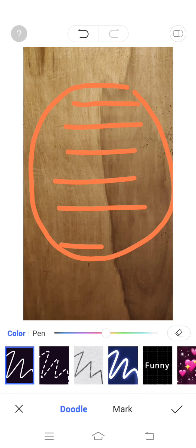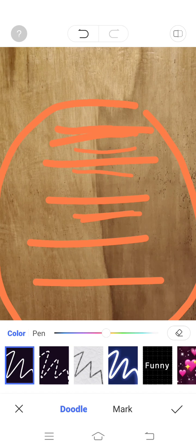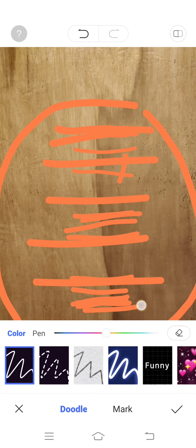They're fused together, but there are lenses at the top area for far. Okay, and these lenses here are for intermediate, and these lenses here are for reading. Okay, just make sure you don't use the distorted area, because this is where the discomfort usually stem from.